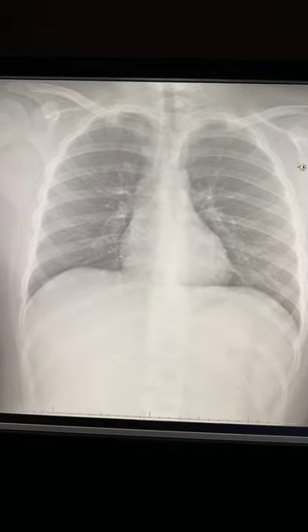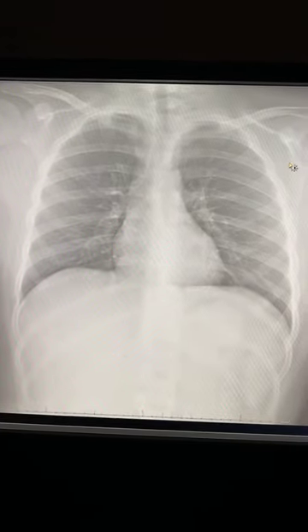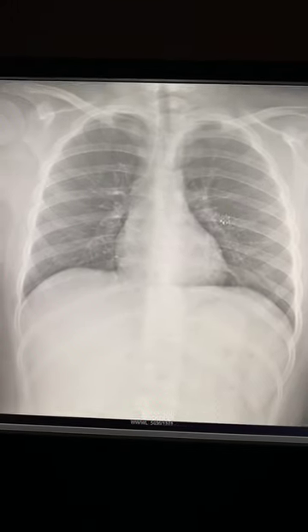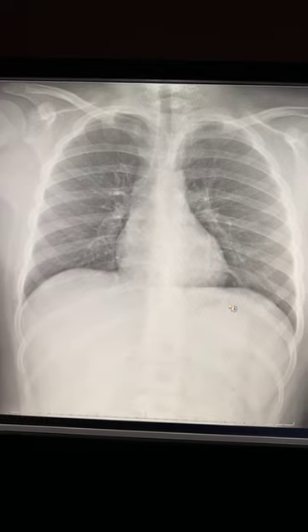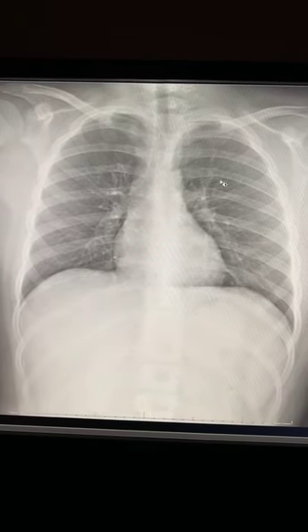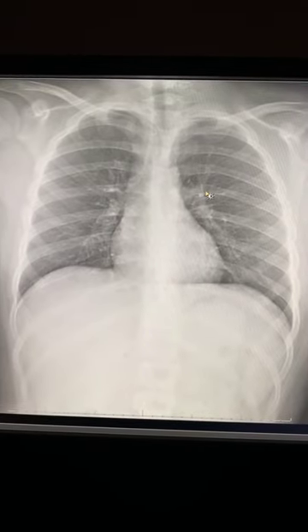The other thing that I want to stress upon, when you pull up a chest x-ray, you better not just read it if it just kind of looks like that and it's all hazed out and you're just looking at it in one view. If you ever sit with a radiologist, they are constantly windowing things. Their eyes are never happy just looking at an x-ray like this and looking at everything that they're trying to evaluate in one color. No, absolutely not.